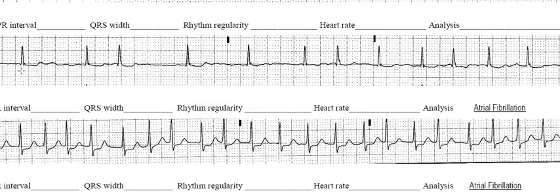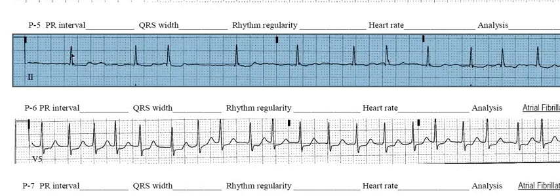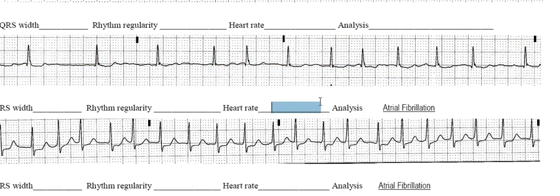Back off a little bit. Let's see, where's my 6 so I know what I'm doing here. From here to here. So 1, 2, 3, 4, 5, 6, 7 get through. So there's a 7. I'll go to the other end of the strip and start from here. 1, 2, 3, 4, 5, 6, 7, 8, 9, 10 get through on that side. So for heart rate, we're going to write a range from 70 to 100.